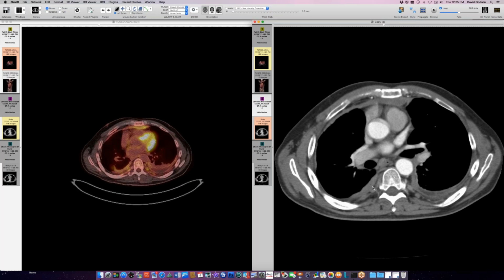You'll occasionally see them with empyemas and with cancer. Right. Yeah, I've seen with pleural tumors, including meso. Yeah, mesos love to do those, guys. Okay. Okay. So let me show you another case.